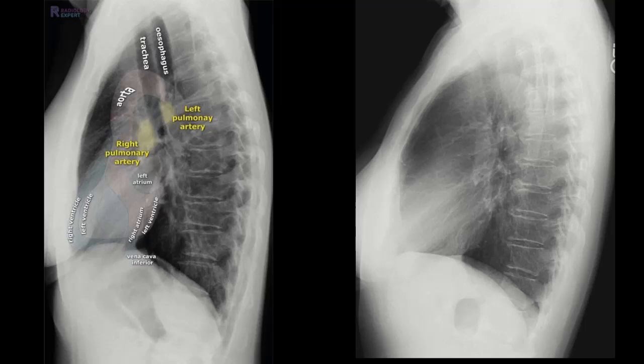So now, looking at the image on the right, notice how the vertebral column becomes clearer the more inferior it goes in the thorax. There are less soft tissue structures obscuring it. Also, the nicely dome-shaped diaphragms. This is another important feature to look for.